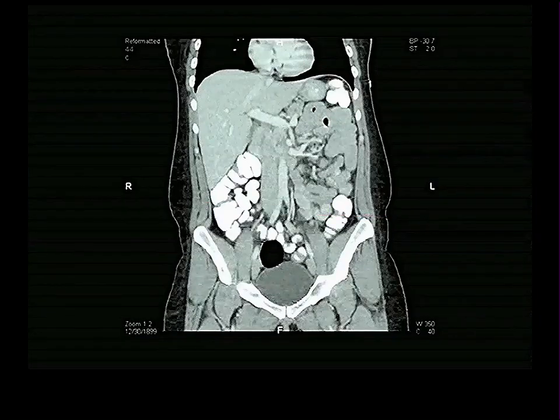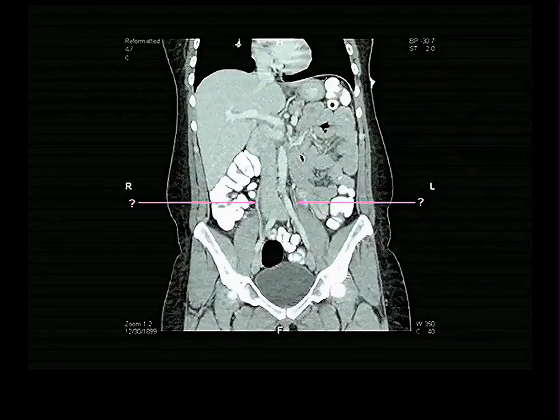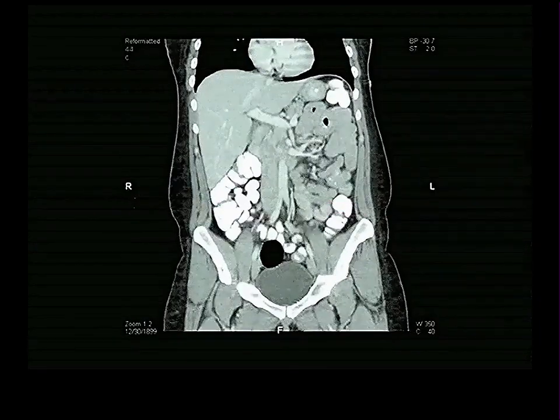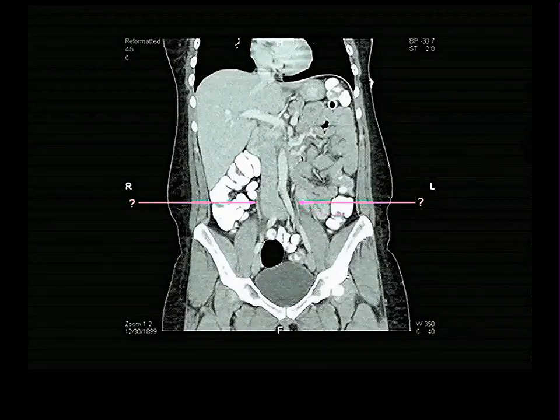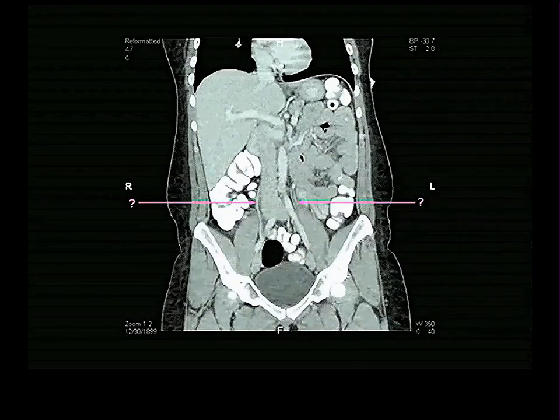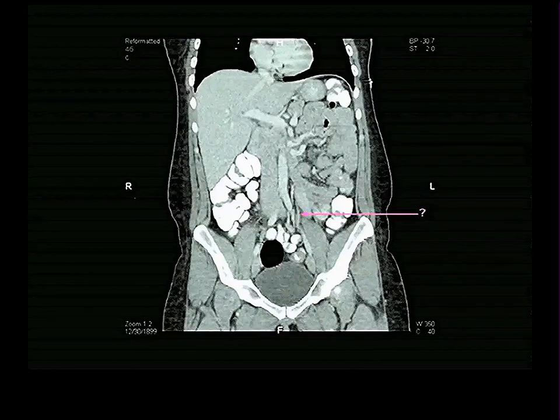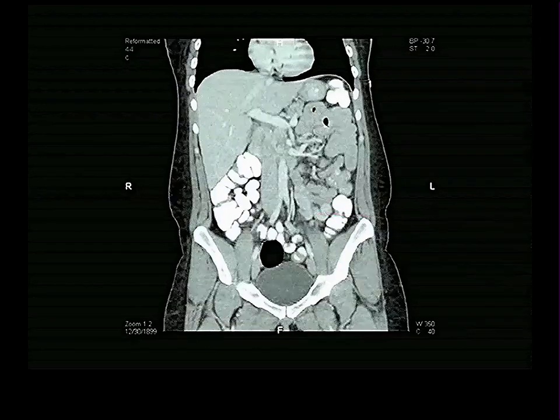Now, what is this crossing? Where is the bifurcation? I'm having a tough time. Is the bifurcation there? I guess I don't know what it is, but I guess I don't care, in the sense that I was trying to talk about relationships, and I've done that. I sure would like to know what it is.